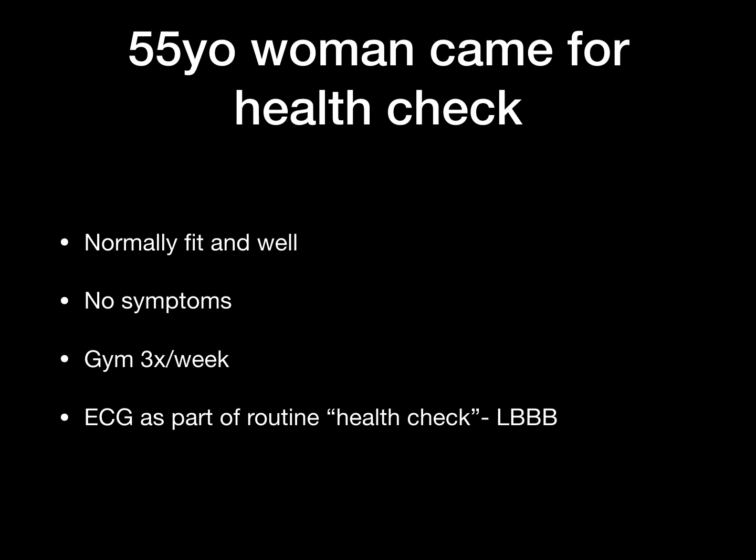Let's go on to the third case. So here's a 55-year-old woman who's come in for a routine health check to her primary care physician. She's fit and well, goes to the gym regularly, has no symptoms, no medical problems, on no medication, but her ECG shows a left bundle branch block.